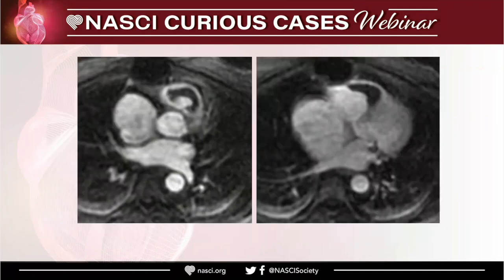So further, we did perfusion imaging to confirm what's going on within the thickening and the apical region. In the perfusion images, we saw that there was a large filling defect centered in the apical region of the right ventricle, and it occupied a significant portion of the right ventricular cavity. The central portion of the filling defect showed no enhancement on the perfusion images in the early as well as the delayed phase, and this filling defect was consistent with a thrombus.